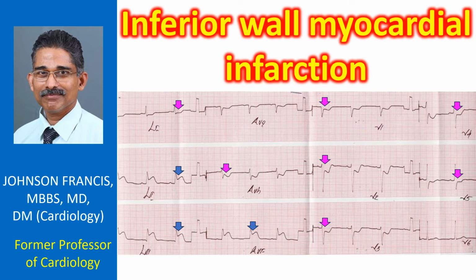The hyperacute phase is diagnosed when the ST segment is elevated and the T waves are upright in those leads. The segment is upsloping in hyperacute phase as the T waves are upright and sometimes a bit tall. ST segment becomes coved as the T waves get inverted in the later phase.